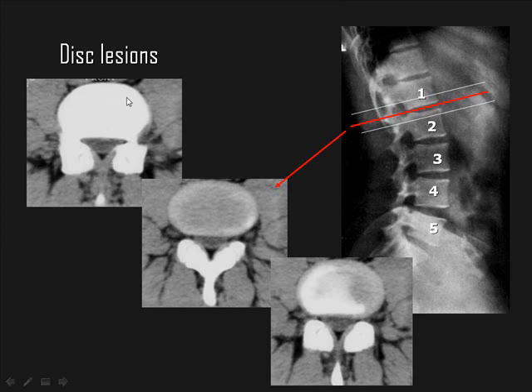And if you look here, this is the vertebral body. And if you look here, this is part of the disc and part of the vertebral body. If you did not align the angle of examination corresponding to the disc angle, you will get all the images like this. Part of the image is formed by disc and part of the image is formed by bone. And these are not suitable for evaluation. You select the image which is almost totally formed by the disc material.